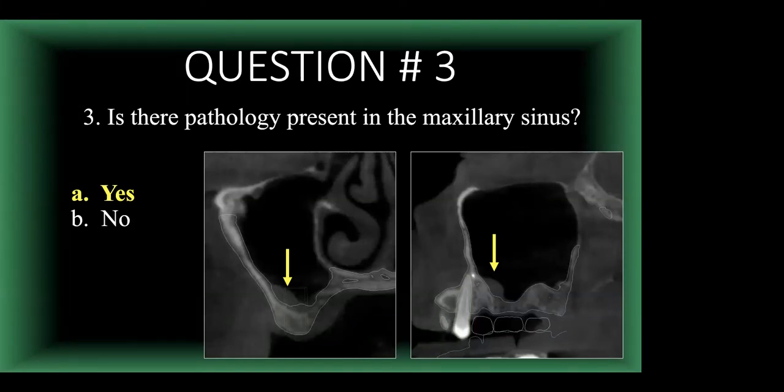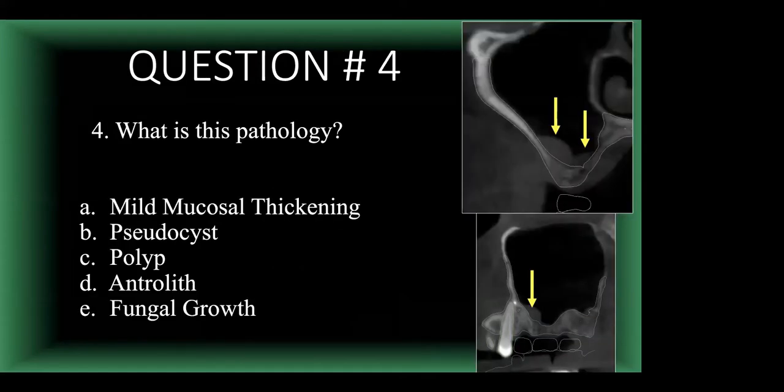is not, basically the sinus cavity should be radiolucent. It should be completely black. It should be air. If it is not air, then anything in the sinus is either an anatomic variant or it is pathology. So you can see by my yellow arrows, this little dome-shaped gray area within the sinus that's less dense than bone, which is what we would term pathology. Not significant pathology, but it still would be termed pathology.